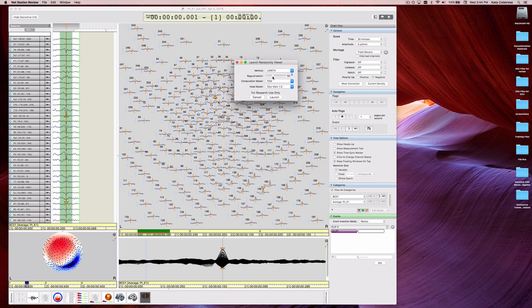Choose your regularization level. Start with values near the provided default. I'm going to keep the selection to -3. This scale uses scientific notation so that 10 to the -1 is more regularization than 10 to the -3. Regularization is a spatial smoothing of the data, so it provides additional smoothing constraints on your results so that you can reduce variance in your data and help the signal-to-noise ratio.